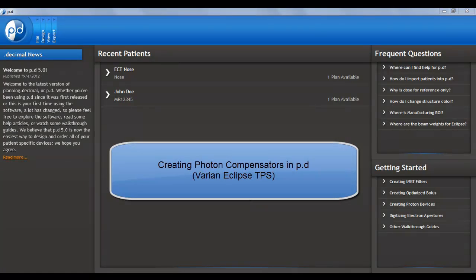Welcome to our PD training video for photon compensator creation using the Eclipse treatment planning system.